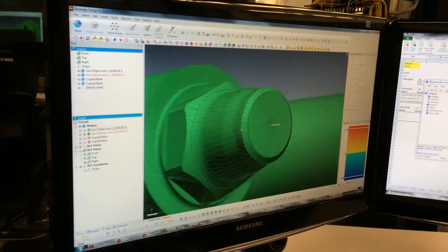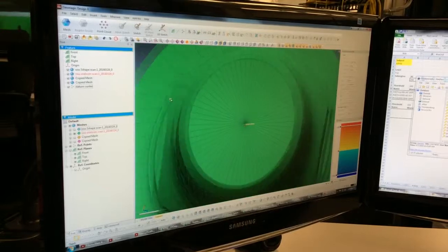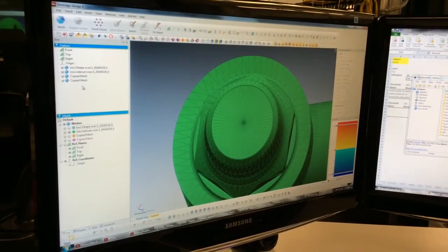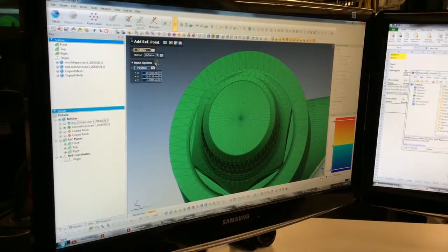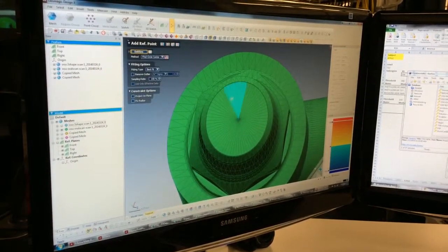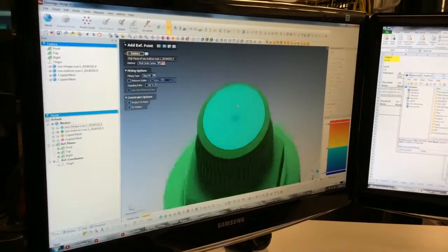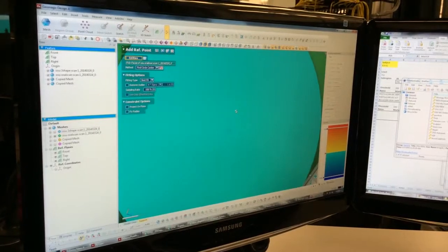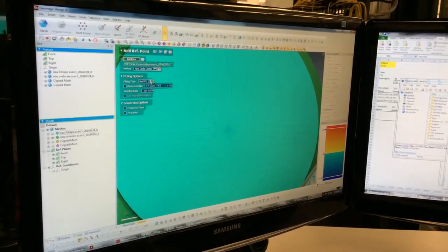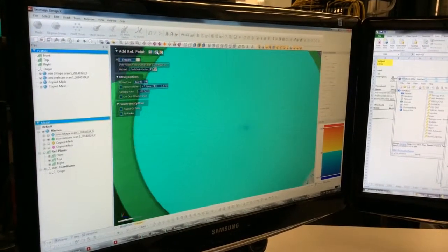Actually, it looks a little bit off from what I would have expected. Let me delete it and see if we can find circle center. I may have not selected all the points we would have needed. Make sure it didn't get anything we don't need. Fitting type, best fit, minimum bound. So let's see. Still off by a little bit.